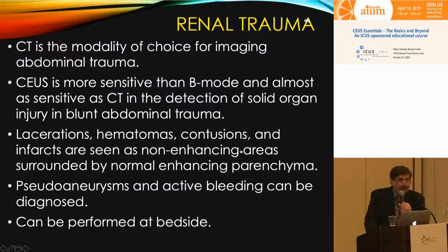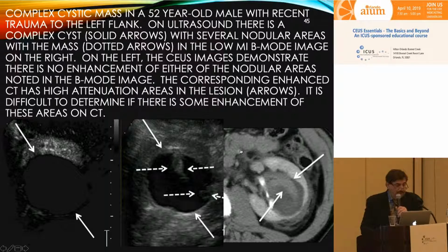So we wouldn't recommend this be the first modality that you use to look at a trauma patient. CT is obviously much more appropriate to do, but if you know a patient has a problem, a laceration of the kidney or spleen for that matter, to do the follow-up with ultrasound contrast is not an unreasonable thing to do. Many of these patients may be in the intensive care unit, and you can do that up there without having to move a patient with a lot of accessory poles down to the CT unit.